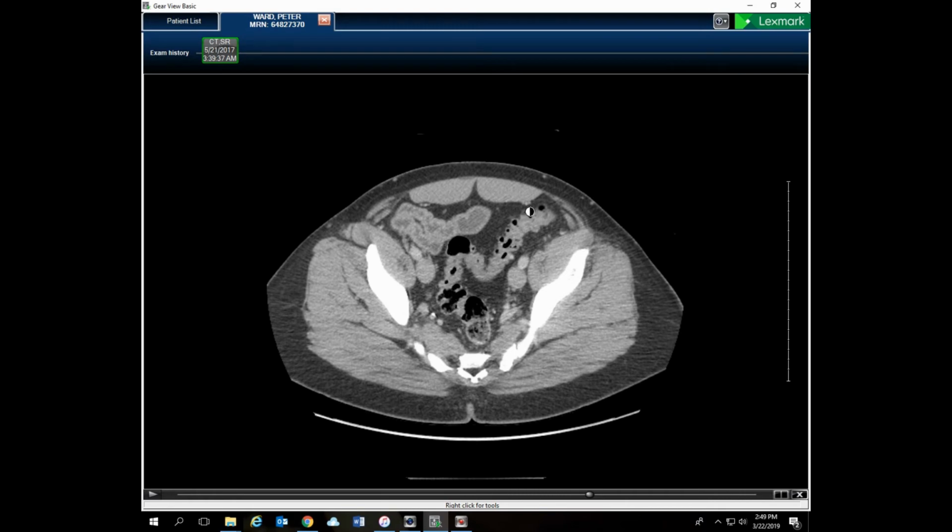Now, for any sharp-eyed people in the room, yeah, looks like I have a little bit of diverticula going on here, so maybe a little more fiber in the diet. Hard to say if those are individual gas bubbles stuck in diverticula or just gas bubbles mixed in with fecal material. But either way, a little bit of a cause for concern. But we'll get back to other health problems in just a minute and the cause of my abdominal pain.